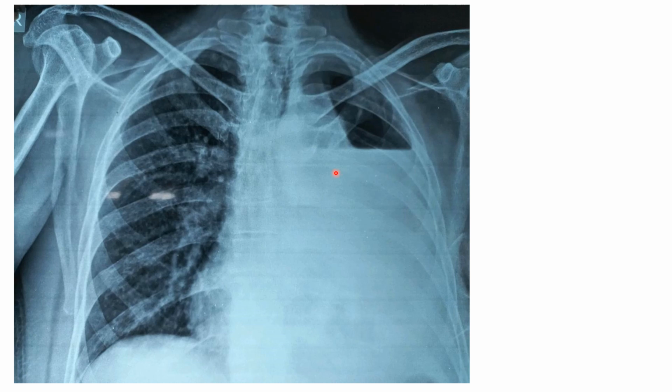Now the key point for hydropneumothorax is it should be through and through. It should start in the medial aspect and end in the lateral aspect if it is a hydropneumothorax, because later on we'll be seeing some X-rays where you will have the straight line confined to a small space, just from here to here, very small length. Then it means that the air fluid level is inside a cavity, right?